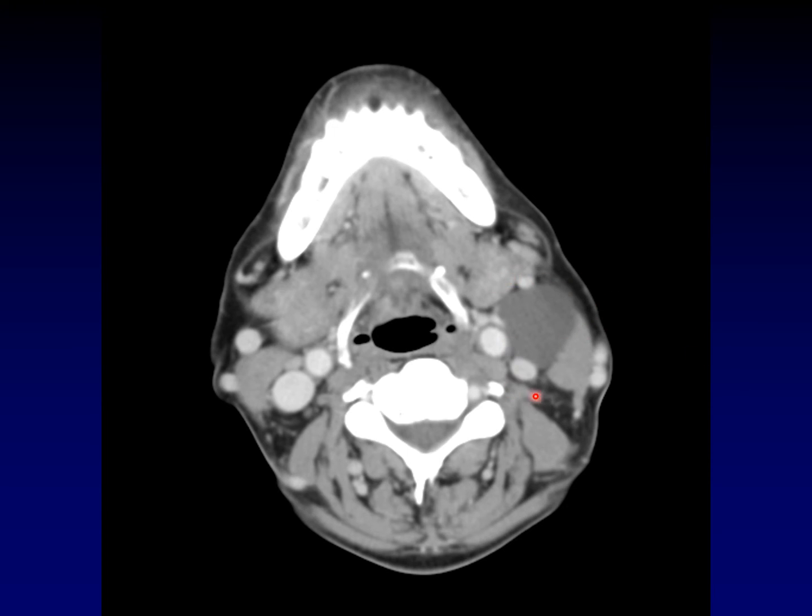It is this location that we are looking for. Be a little bit careful because lymph nodes can occur in this location too, but if you see a simple cystic mass with no wall in this location, it is likely a branchial cleft anomaly, particularly if it arises in a teenager or child.